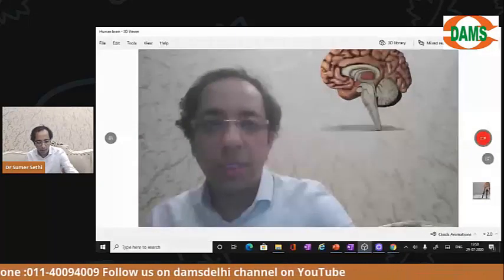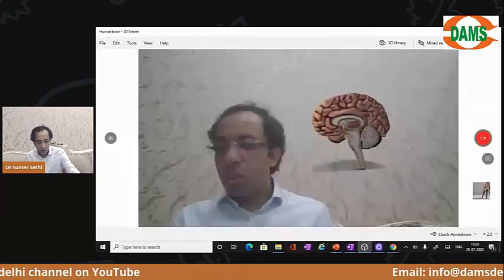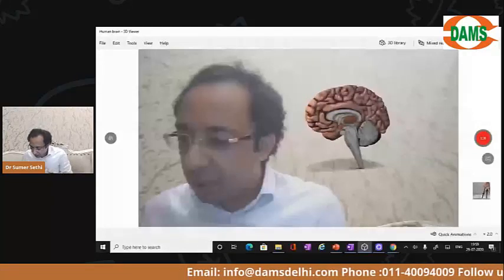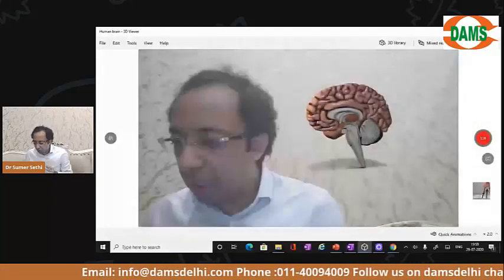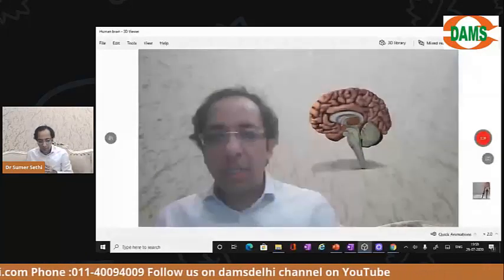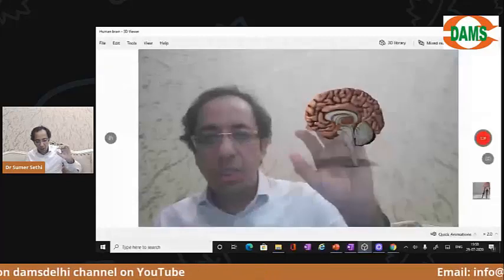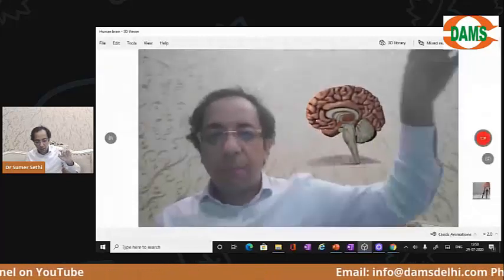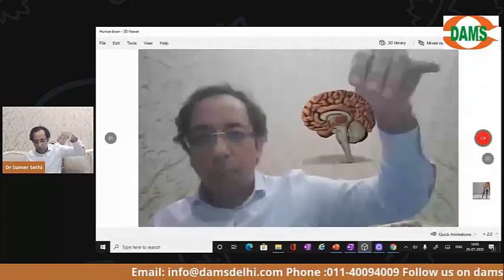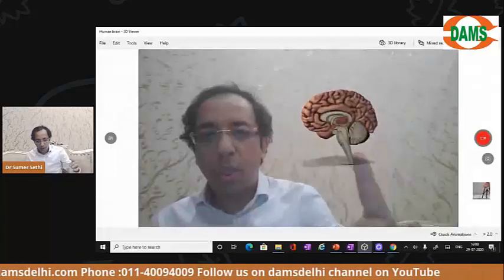Okay. So in radiology, the right and left is always inverted. I will explain it to you better. But before that, please see with me that this is how your brain actually is. So this is your brain in actuality. In the front, you have the frontal lobe. On the top, you have your parietal lobe. Behind, you have the occipital lobe. Below the occipital lobe, you have the cerebellum. This is the area of your brainstem.